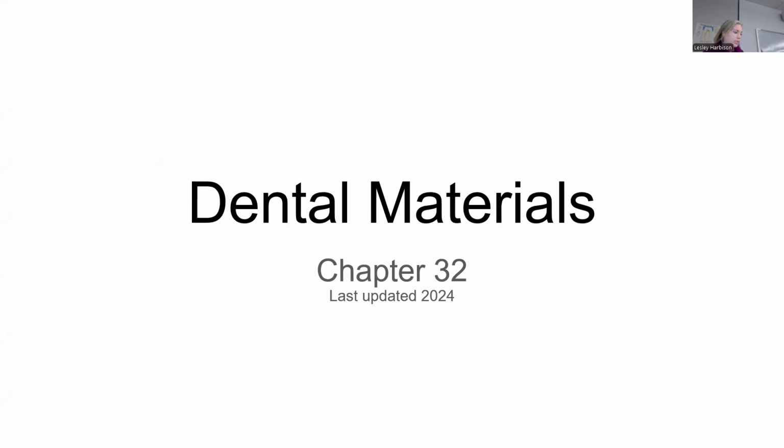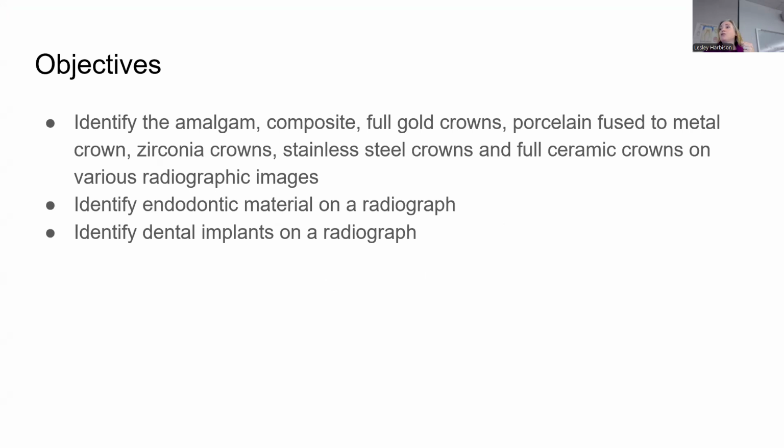The PowerPoint that we just left has really good slides because they add in other things like an amalgam tattoo, which is amalgam embedded in the tissue, or a space maintainer or something ortho. So definitely go back to that after we go through this.